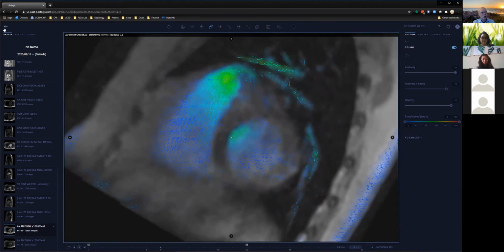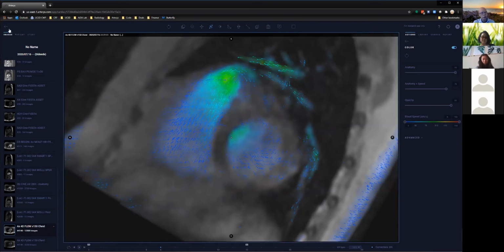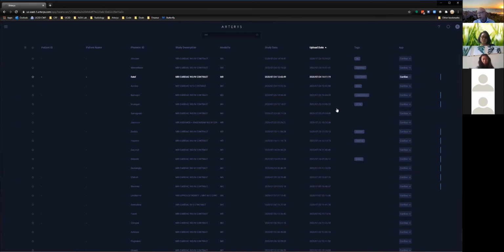All right, that's a lot of time spent on a PVR, but I think I showed some valve tracking, some sort of dynamic interrogation of the atrial septum in short axis, long axis, and some flow measurements. What else can I show you guys?